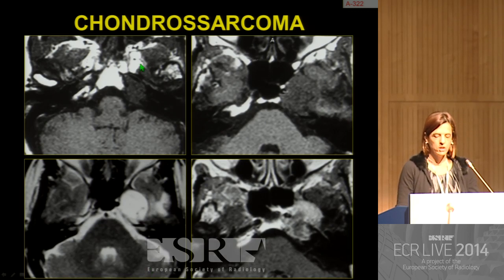So this is a lesion located in the parasagittal central skull base. You see that there is a replacement of the fatty bone marrow of the petrous apex and clivus, and this is sitting in the region where the sixth cranial nerve crosses from the posterior cranial fossa into the middle cranial fossa through the Dorello canal, and actually this patient presented first with diplopia.